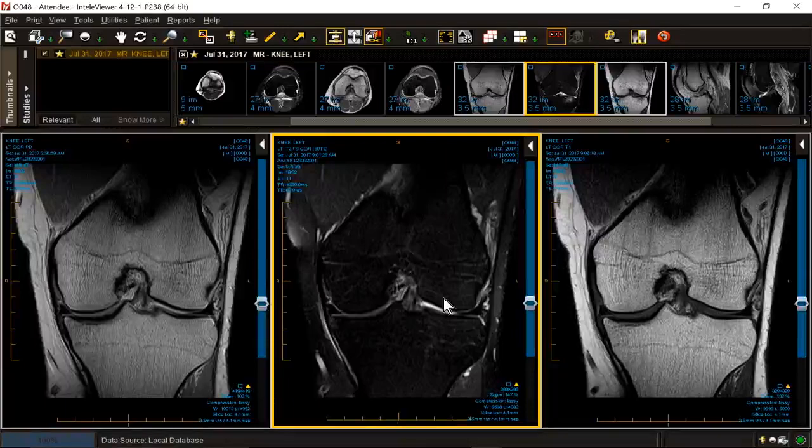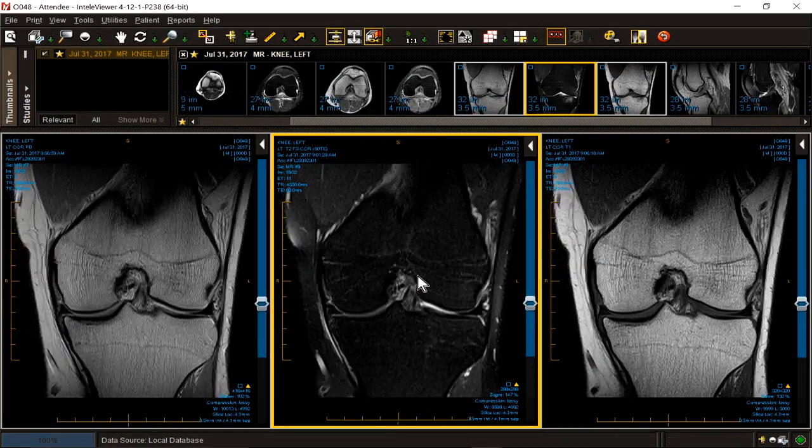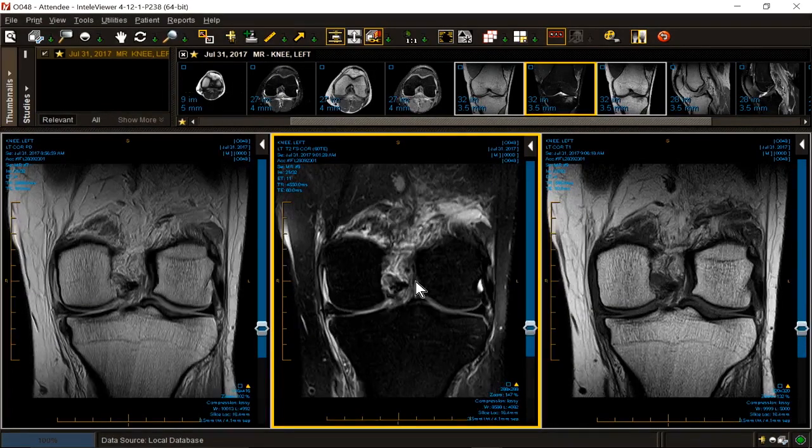If it's hyperextension, we'd be worried about a knee dislocation, but the ACL is intact. So more likely, direct blow. With a direct blow, we'd be more worried about driving the tibia backwards and rupturing the PCL. That's a classic mechanism for PCL injury.